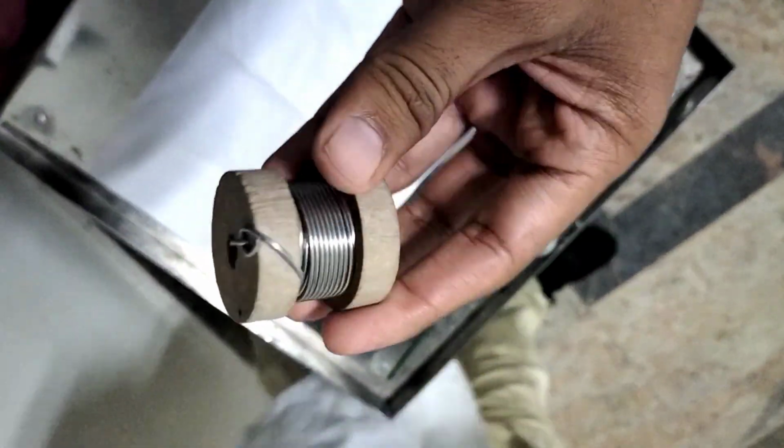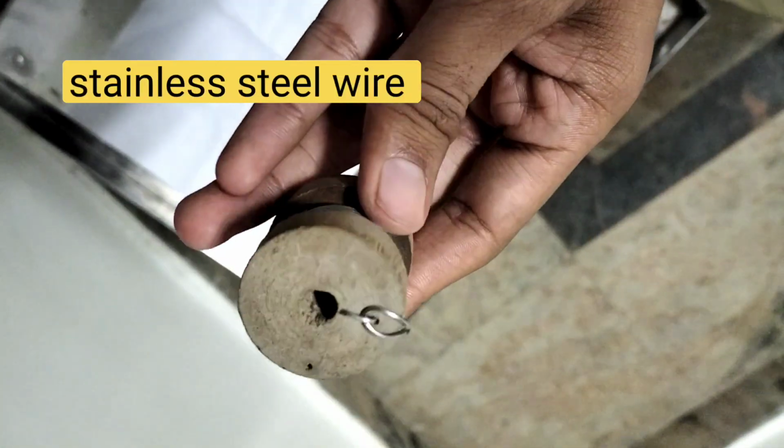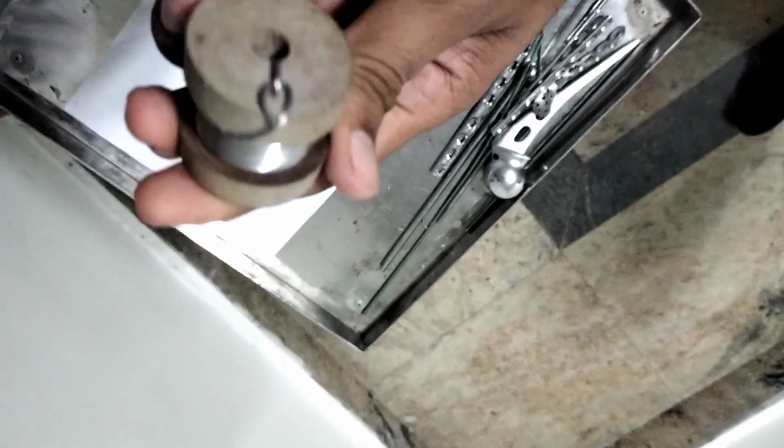Here you can see this is the SS wire. SS means stainless steel wire. It is used for tension band wiring. It is used for olecranon and patellar fractures.